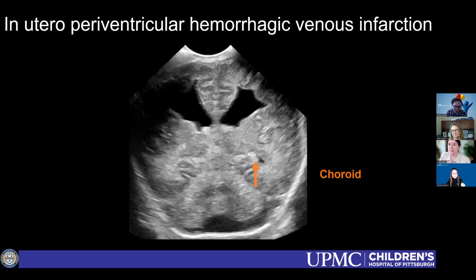Yeah, I totally agree. In a case like this, especially where it's kind of a diffuse symmetric abnormality, the ventricles are clearly abnormal, but the brain parenchyma I find can be very hard when it's a diffuse process. So having something that you have as an internal control like that is definitely a good point. That can be very valuable to have something to compare to. Yeah.